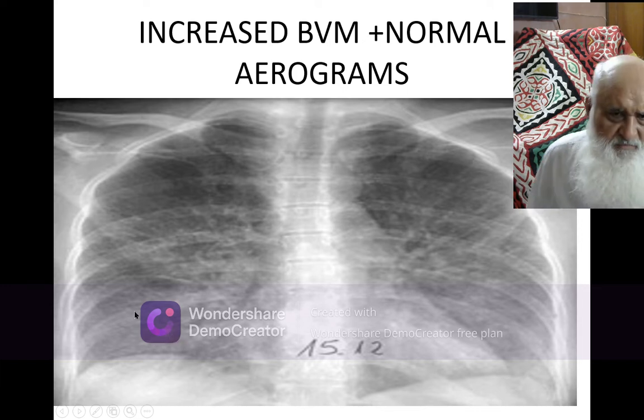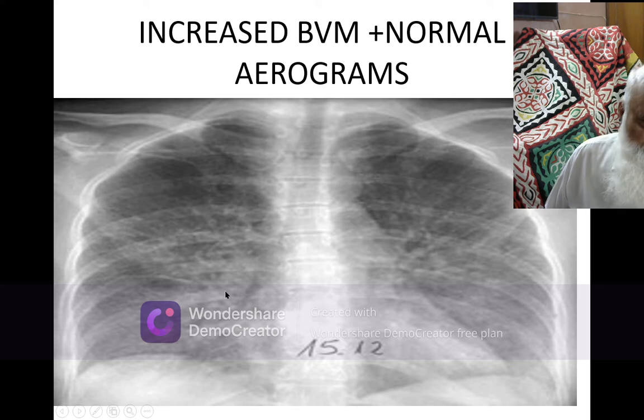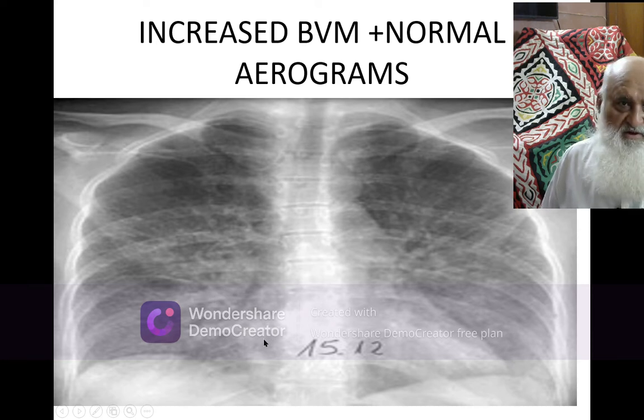No problem. Do not become panic to see these types of X-rays. They are very common. So it is the increased bronchovascular marking plus normal aerograms.